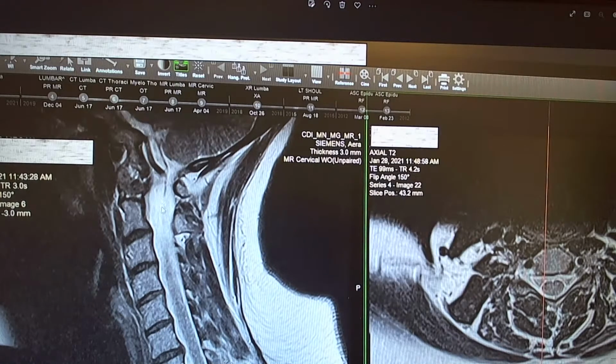T2 shows wherever there's more water. More water means edema. Edema means some process brings more tissue, water there, and that shows where there's a pathology. Whereas T1 shows more anatomical view, meaning that many of the borders between the areas are better visualized in T1. They show different things.